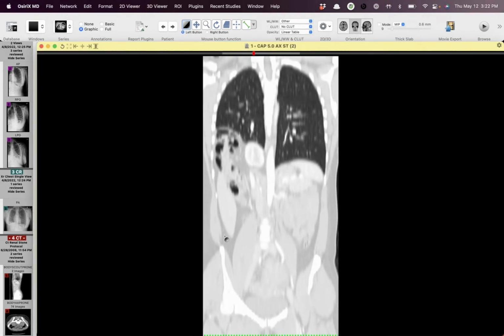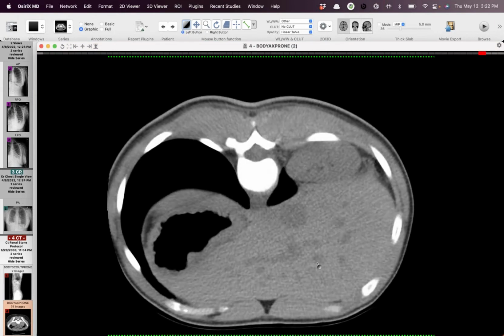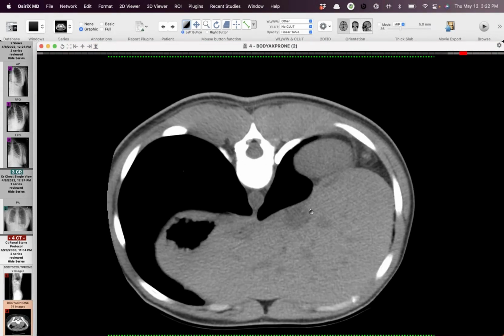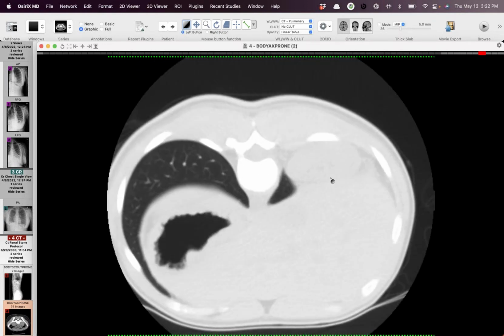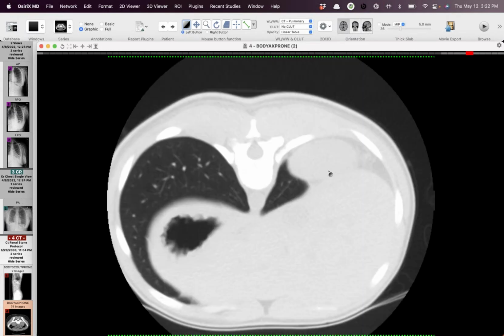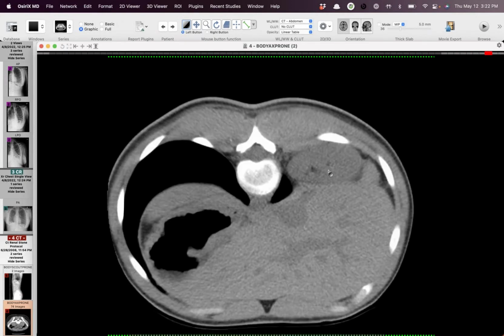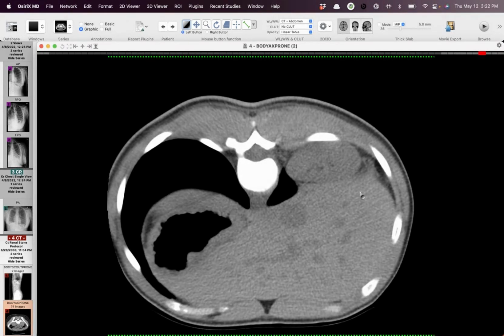So the question is, is this a traumatic hernia that's acute, or is it a slow enlargement of a pre-existing hernia? And that was our question too. At first we were thinking it was probably traumatic, but then we found this old CT, and she's prone here. Her kidney's way up by her liver, even 14 years ago. So my best guess would be that this is some sort of congenital hernia that may have been associated with the scimitar. And I think you can see there's a diaphragm slip here, and also, does the prone position for some reason cause it to reduce more than when she's supine?